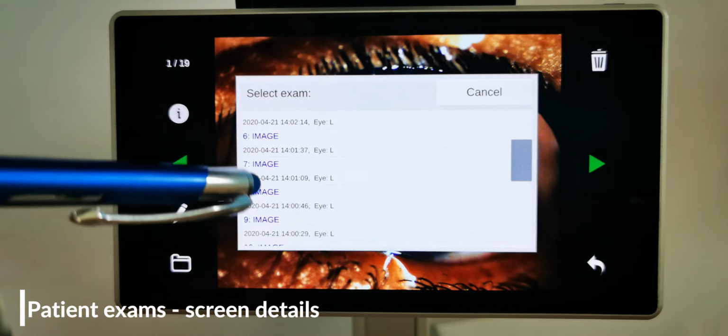Select the file icon to store the current image or video on a USB mass storage device attached to the USB port located on the left side of the SLI-200. To delete an image: when working in registered mode, only one chosen image can be deleted. When working in anonymous mode, the current or entire anonymous file repository can be deleted.